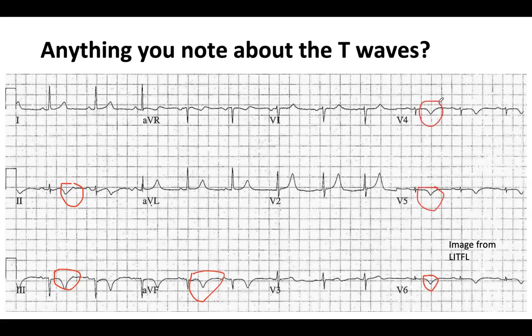Okay, and then the T wave in AVR. Can you see it's kind of biphasic? It's not completely grounded. Oh, sorry, pointing at the wrong thing here. So there's your P wave here, QRS, T wave. And then in V2, I'd say this is quite a prominent T wave. But again, isolated without any history, you'd need to know more about what's happening. I think this was actually a patient who had a myocardial infarction.